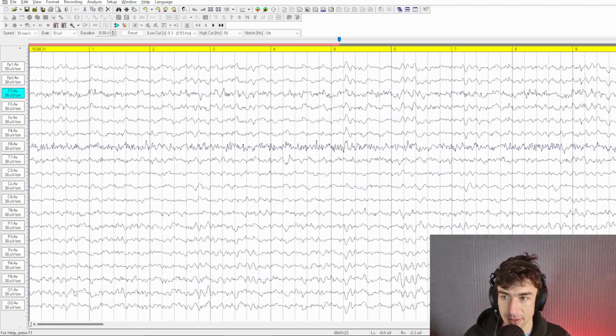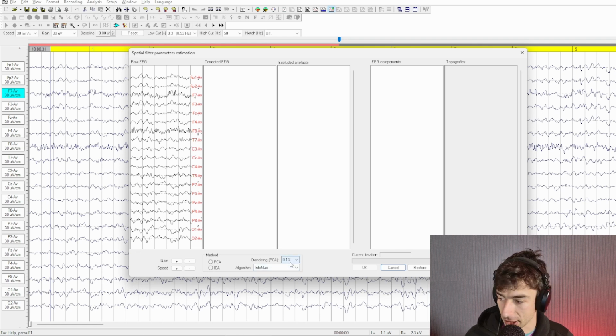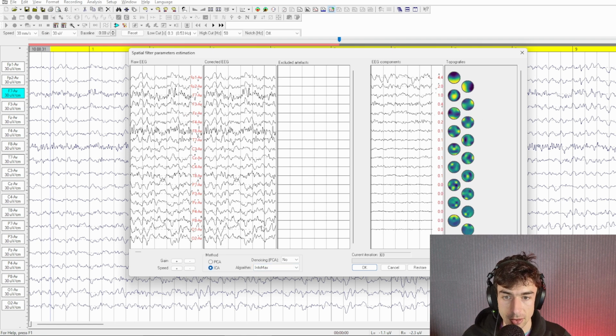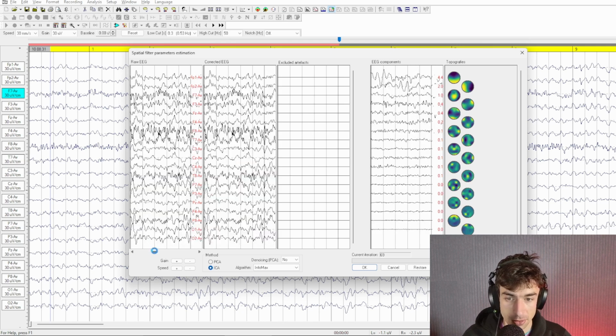So I just right-clicked at the end at the top here, and I'm left-clicking on the left bound to make a selection for the ICA artifact rejection. And I am turning off the PCA denoising. And we'll run the algorithm, and it did not take very long at all because it's a very short record. And our hope is that we're going to be able to isolate the components that we're actually interested in, which it seems like are only really the EMG.